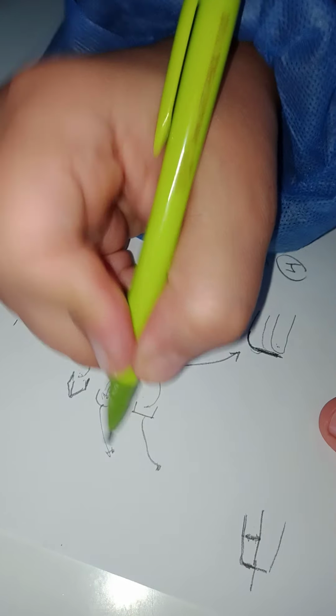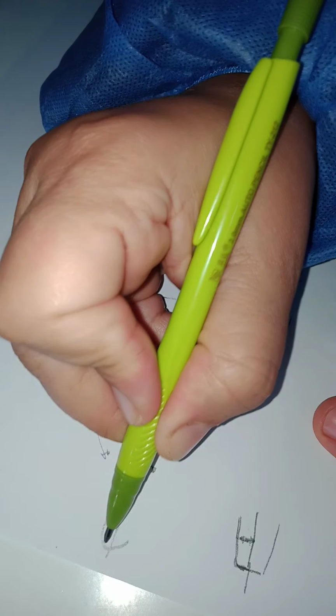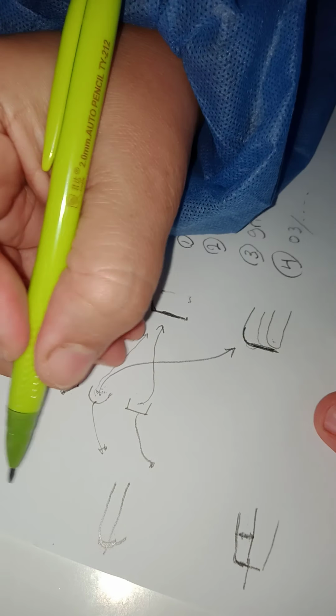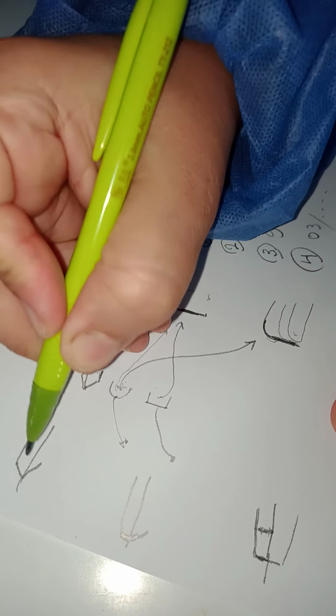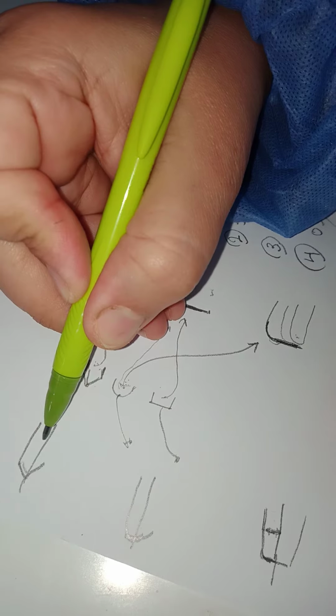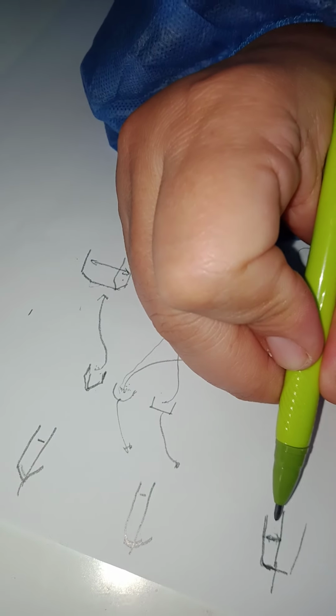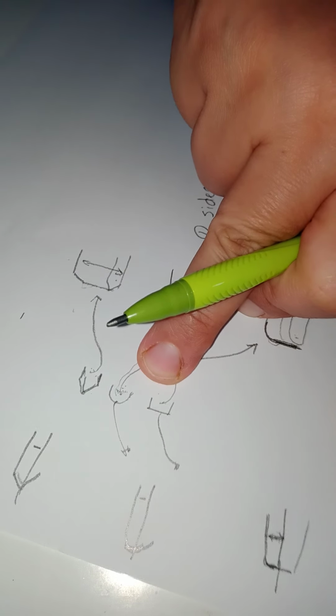If I use the round bur, this is the surface. I go in halfway with the round bur, and I'll get the chamfer with a rounded shape at the end. If I use the chamfer bur to create a chamfer and go in halfway, I will get this shape of the finish line of the chamfer. But because the amount of reduction here and here and here is minimal, I call it a chamfer. So the chamfer preparation is defined according to the axial reduction, not the shape of the tip of the bur.